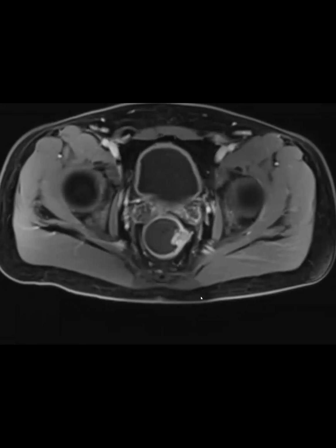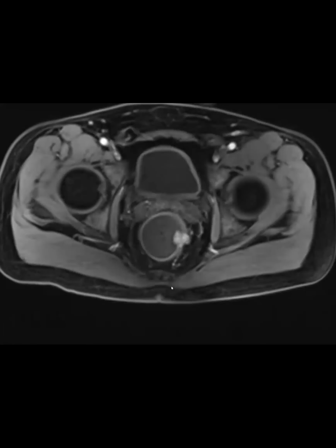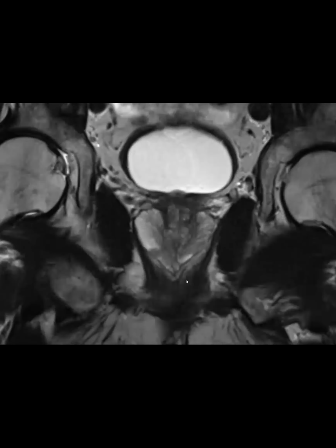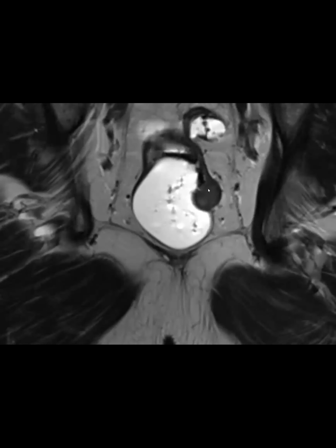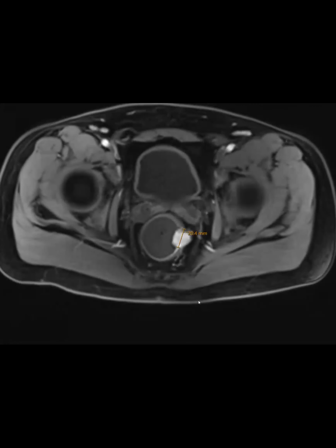Any thoughts? Well, I wanted to say rectal cancer, but it's enhancing and washing out avidly. Yeah, rectal cancer is usually not this avid, right? Some kind of vascular mass. So can I put neuroendocrine tumor in there? Yeah. I don't think it's our common variety. What else? Is it a MET? Great thoughts. It was not a MET. Those are both should be in the differential. And this turned out to be a neuroendocrine tumor.